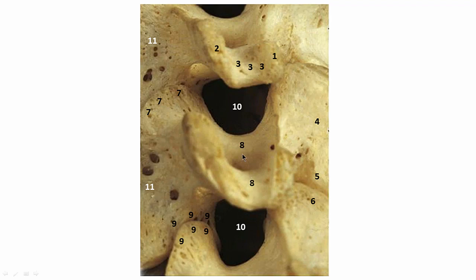This is actually number 8, the neural groove of the transverse process. What goes in that? It's a good test question. I'll probably ask you that in class. Well, that's the groove for the spinal nerve. Remember, just as the root comes out here, it turns into a spinal nerve, and the spinal nerve immediately splits into a posterior ramus and an anterior ramus. The anterior ramus, aka ventral ramus, is the one that goes through this groove. Some call it the anterior division, but I like the anterior or the ventral ramus.